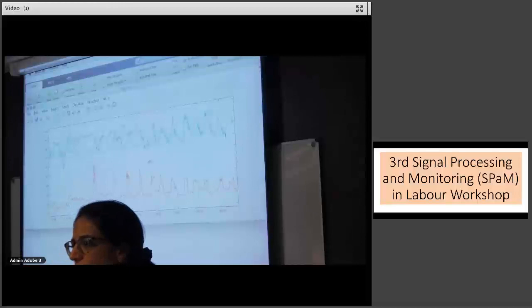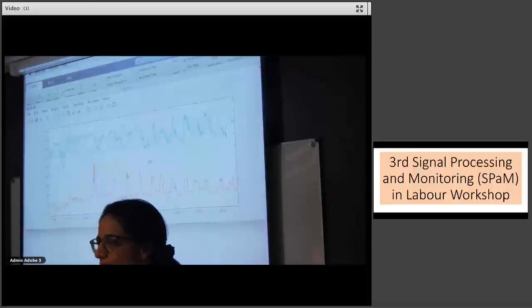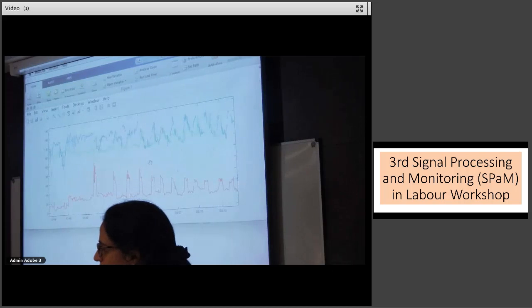No, but that's not baseline. It is calculated in the absence of a deceleration and in the absence of an acceleration. That's why you can get a basal rate at the beginning of labor before all of this starts. And then if you find, you need arbitrarily a minute.